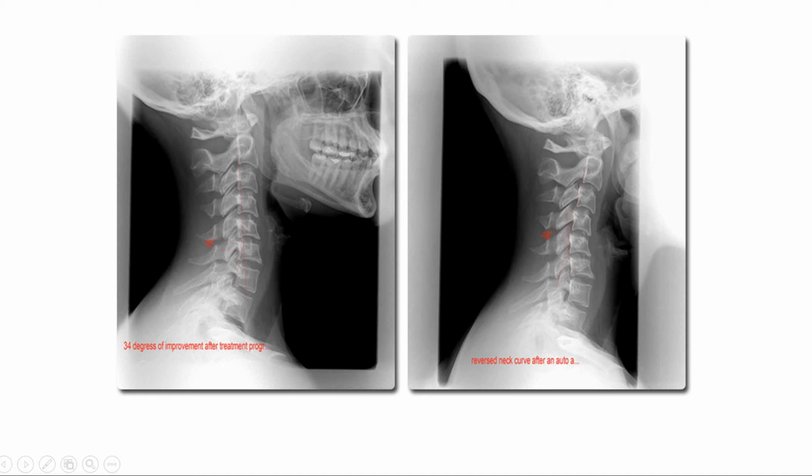Okay, look at this one. See how this neck or cervical spine has a reverse curve. So if you look closely, it's curving the other way. These are very painful. Typically when I see these patients, nasty headaches, lots of neck pain, trapezius muscles inflamed and on fire. They're miserable, okay? They're tired of taking the pain meds. Typically they take them for years and years, and it's getting worse, and they're tired of it. So they come in, and it's like, wow, look at all this that's going on in your neck.